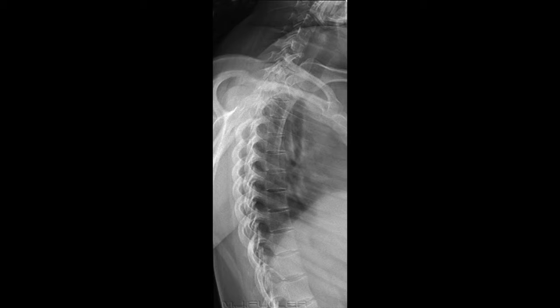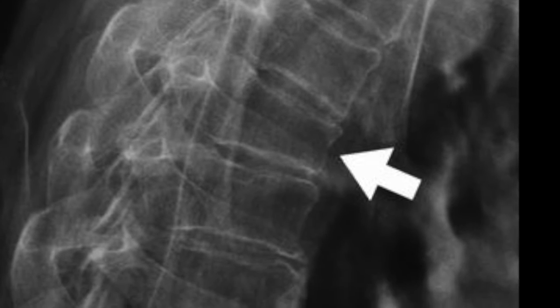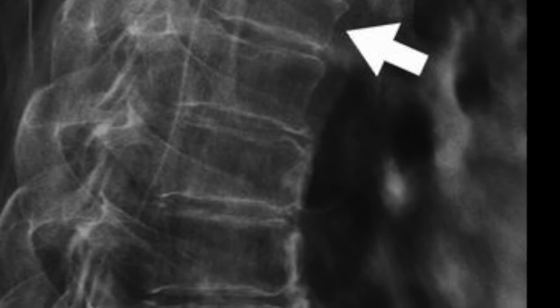It demonstrates the cervicothoracic vertebrae between the shoulders, appropriate penetration through the shoulder region, C7 to T1/T2, the humeral heads minimally superimposed over the vertebral column. I would also use a 10 by 12 lengthwise cassette, and I can either do this image on expiration or also a breathing technique.